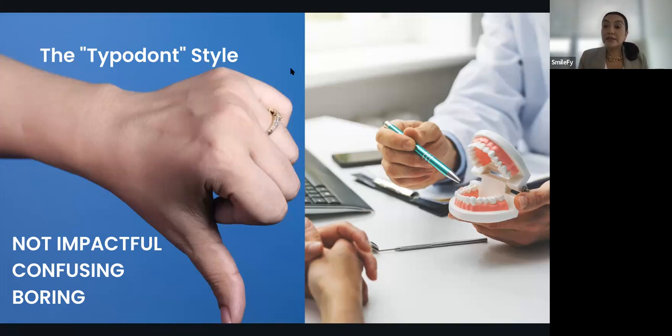Oh, baby, I have this space and probably I can place an implant here. Or if you are doing ortho, what about shifting the midline? Even if you have techniques and devices, tools that provide you one specific idea of how it's going to look like, nothing else compares to having the picture with this smile design.